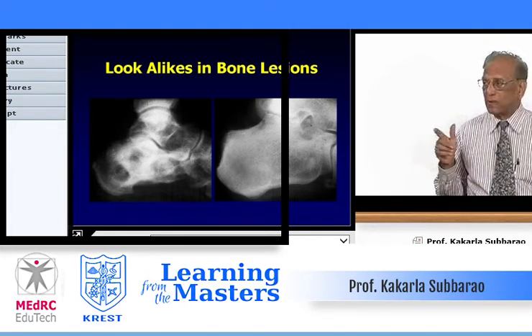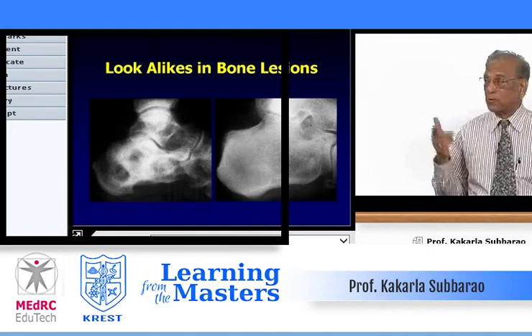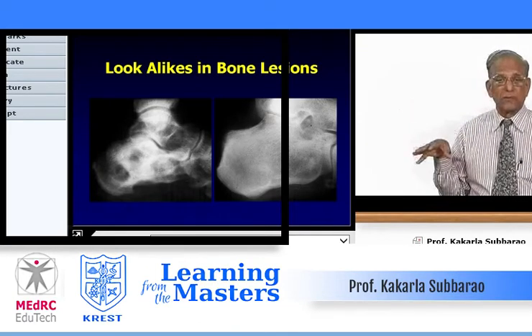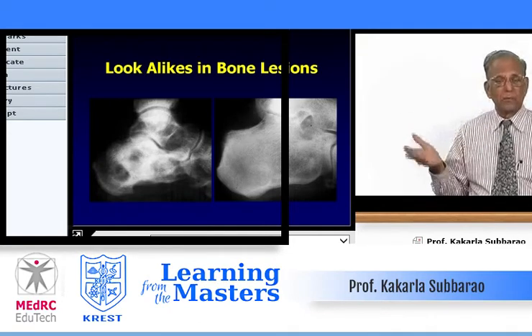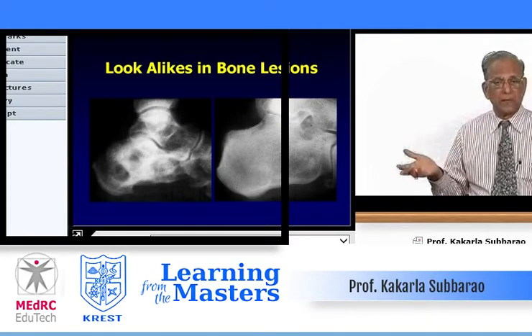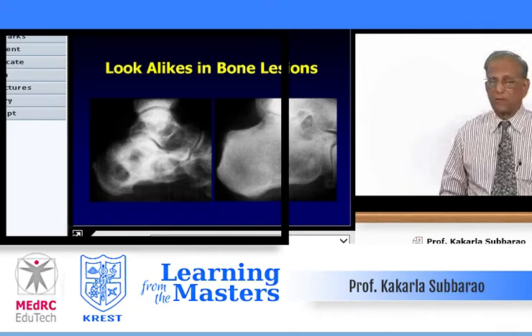Again, note, there is no periosteal reaction to think of osteomyelitis, acute osteomyelitis, or pyogenic type of osteomyelitis. Could be tuberculosis? Tuberculosis should not produce that much reactive bone. Very rarely, maybe 10% of patients may produce it, provided they are under treatment, the resistance is high, with low dose organisms. But this is classical of a fungal lesion.